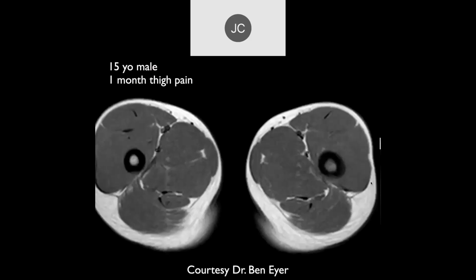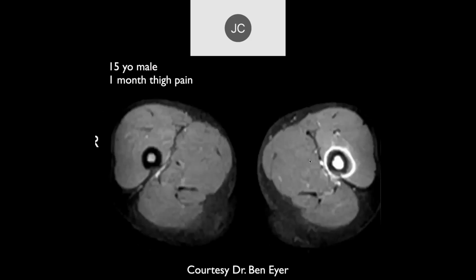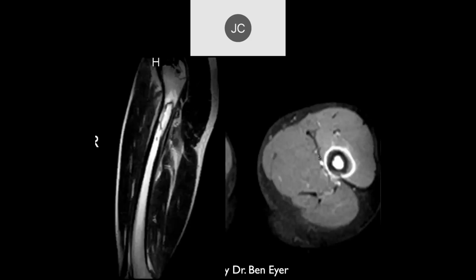Here are the axial images, T1s. So again, on the left, you see a little periosteal signal here, lots of signal there, and then thickening of the cortex or periosteum. And there's the PD fat set, with hyperintense rim surrounding the periosteum. So it looks like there's some periosteal edema, some medullary edema there, maybe a little irregularity of that cortical bone, like you said. Here it's very irregular.